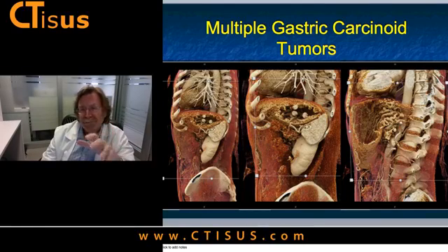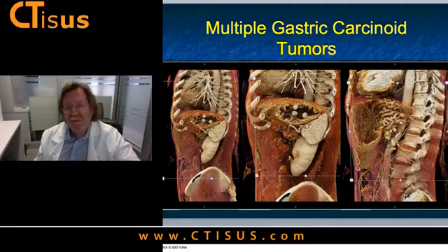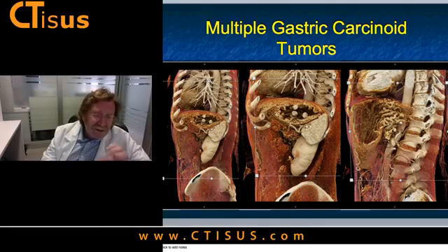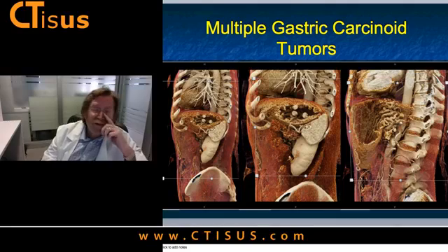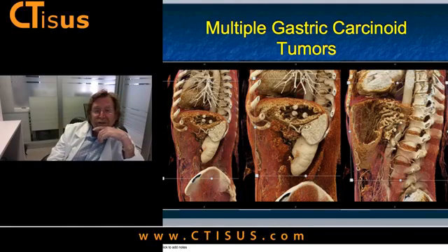Again, the interactivity has really gotten good. Before, we would do a lot of downsampling, so you would get to a certain point, you would downsample, and it would be very, very hard to know exactly what the right parameters are for looking at a case. Now I can do it and get the right parameters. It jumps back a little bit when you stop, but I can probably overcome that by memory. So that works out pretty well.